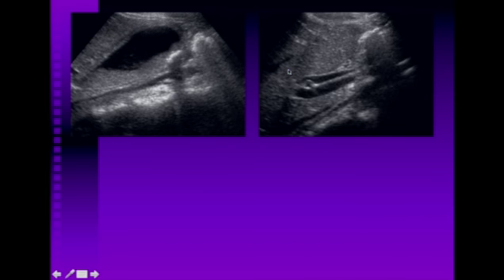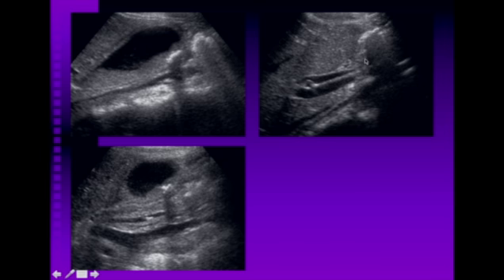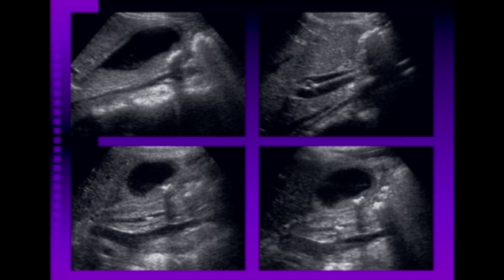Our next case is showing again echogenic foci with shadowing in the dependent portion of the gallbladder, and we also have gallbladder sludge layering. As we follow it down, we'll see ductal dilatation coming in an oblique plane, and then we have one focal lesion with shadowing in the common duct, and again a little better view of it highlighted by this circle.